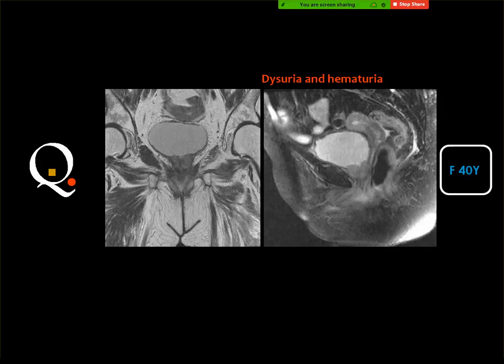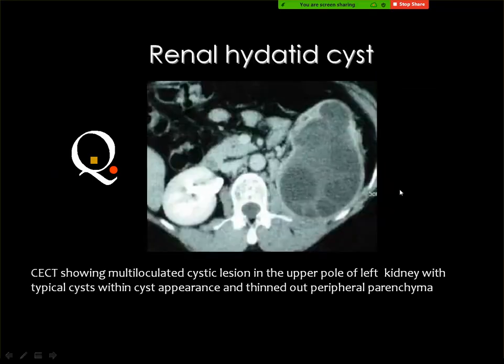Doctor, how do we differentiate between it and multilocular cystic nephroma? Yes, multilocular cystic nephroma is a big lesion that does not enhance, and the cysts are not on the periphery of the lesion. They are totally occupying the central part, the whole size of the tumor itself.